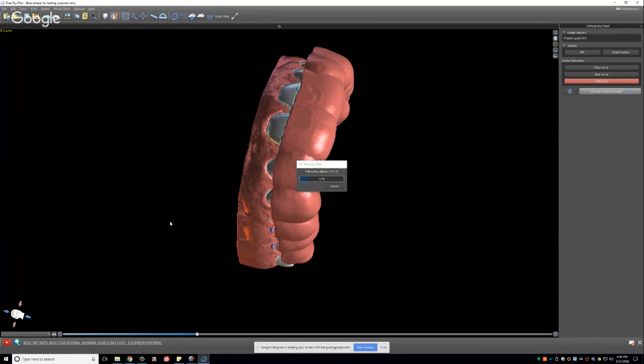Honestly, it's not built into the ortho software, but if you were to open up any of the output models that you created, the models that we would export from here for printing, in the surgical guide software, and then use the align to model tool, you could use cusp tips and various other anatomic points to align the models, and then you would see how well they're aligned. It's just for visual. Yes, that would be super easy to do.